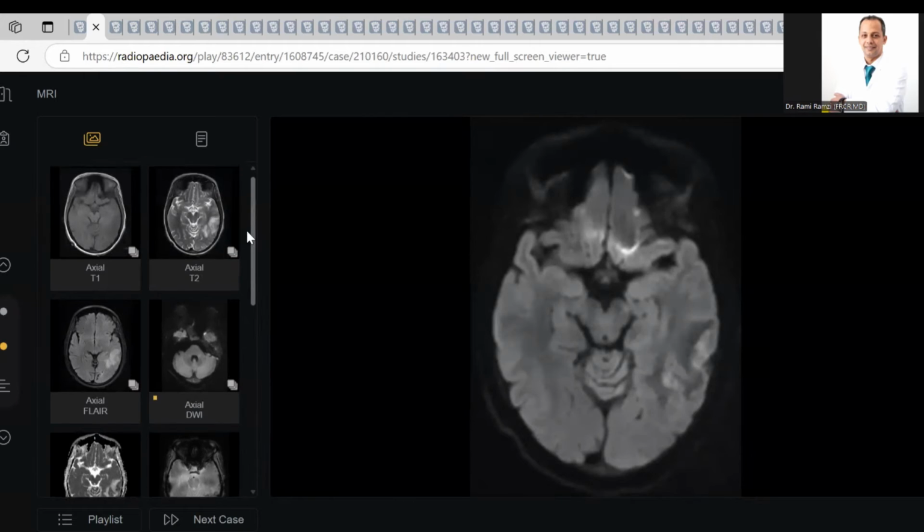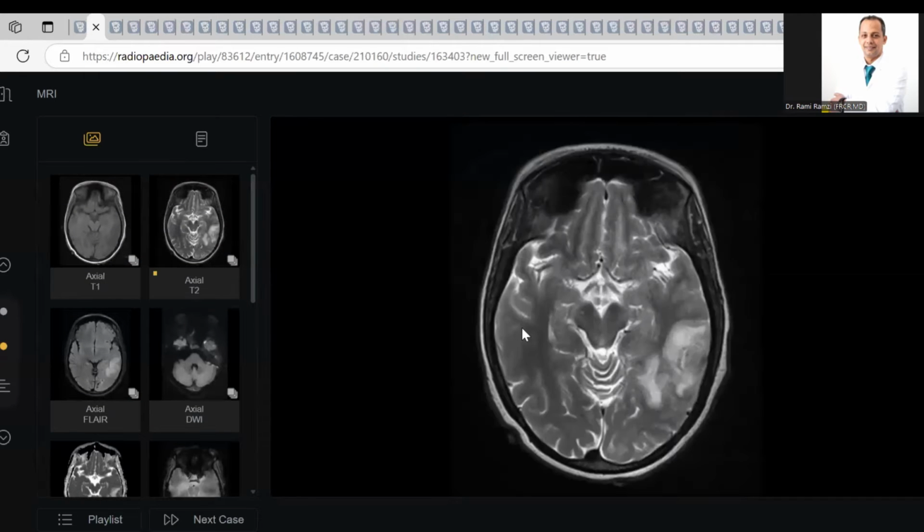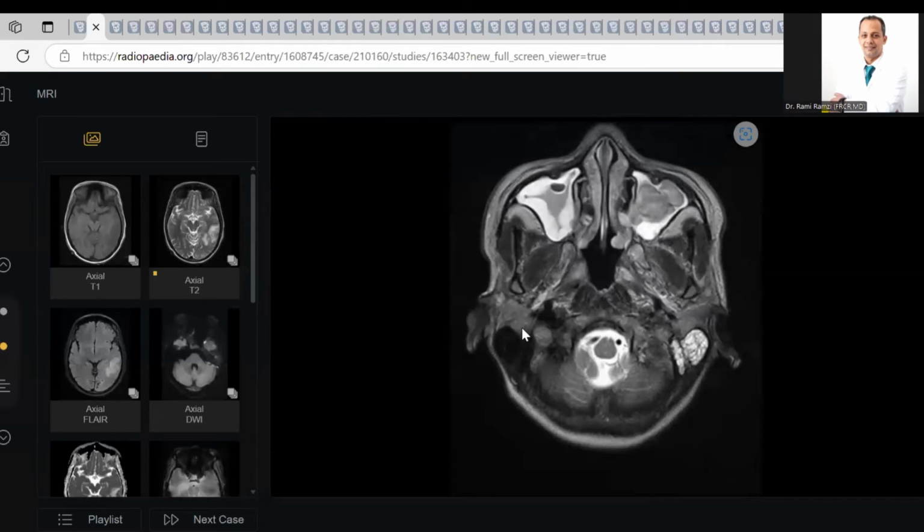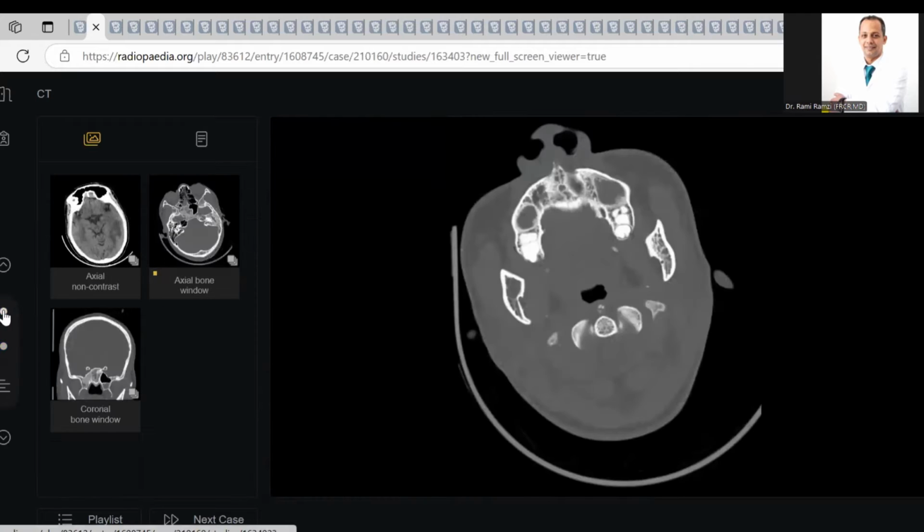This is very critical, Dr. Roshni. Look here, please, and tell me. The key is here. Very important. Here, what type of infection? Fungal sinusitis. Yes, fungal sinusitis. Thank you, Dr. Roshni. Time is up. We will wrap up this case.